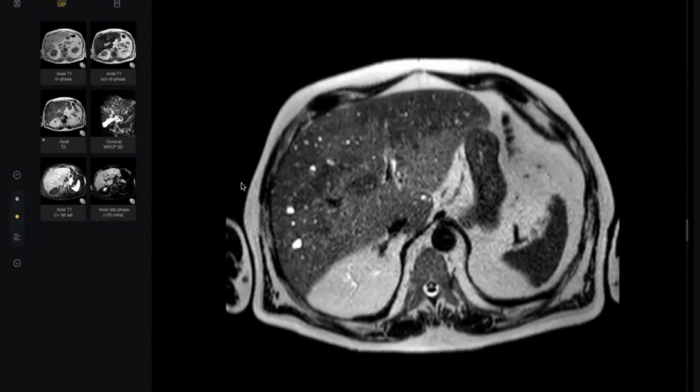There are no soft tissue components in these. Biliary hamartoma is very characteristic with one buzzword, bizarre shape. Bizarre shape. Okay? So give me another differential.